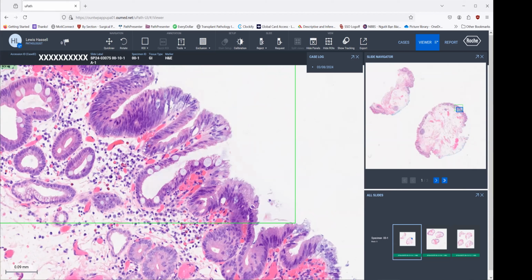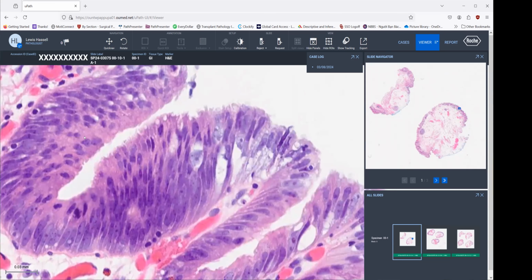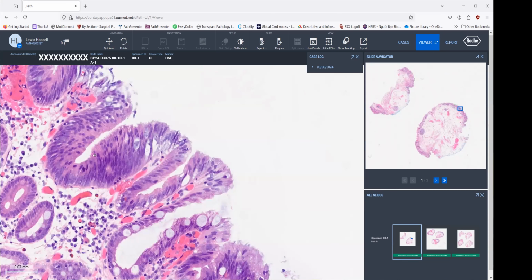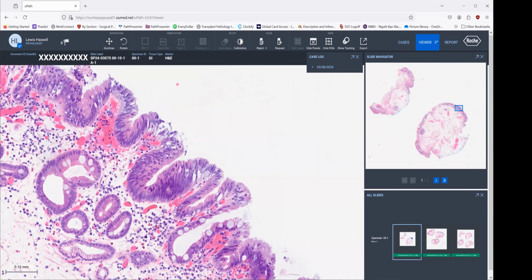And then beginning right here, we have an area with increased stratification, a little bit of loss of cytoplasmic mucin and demarcation lines. And we also see that the nuclei begin to have a few nucleoli. You can see those here. So this little small area, I would deem as a small area of low-grade dysplasia.